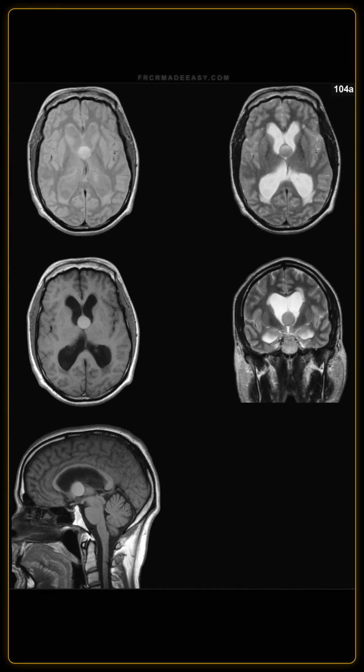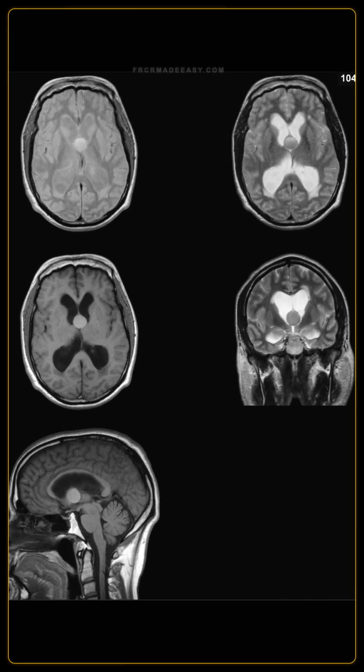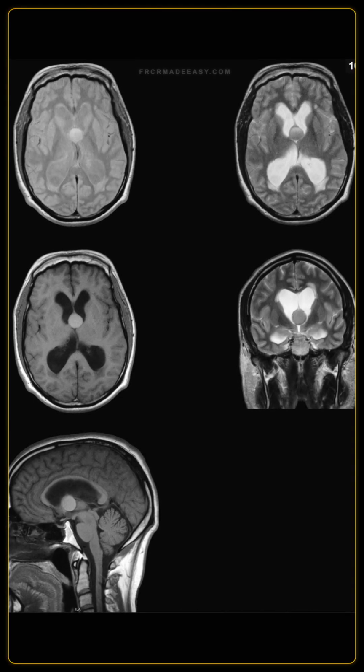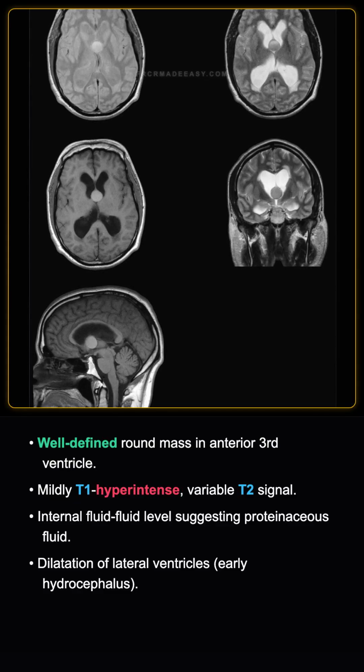A 21-year-old male presented with positional headaches. I am showing you multiple brain MRI slices. Describe the findings.